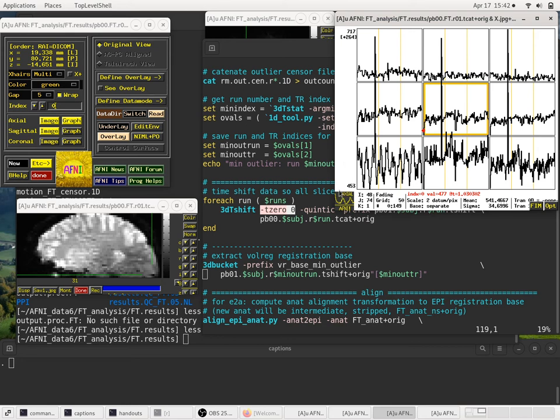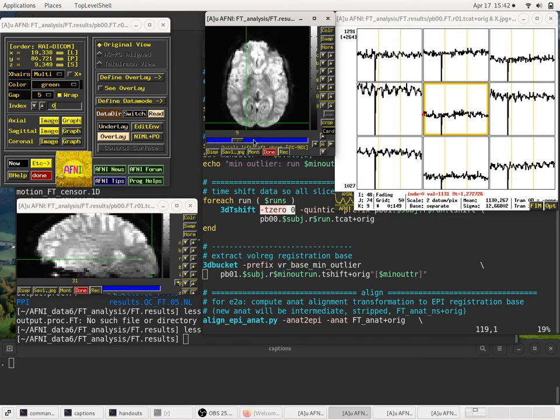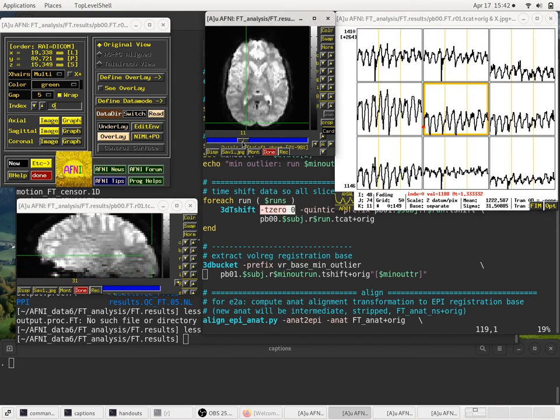Just to note what this looks like over time, let me jump back to slice 11, say. That's where we were at. And so we're at time 1.33. If I jump through time here, if I put my cursor over the graph window and hit the right arrow or the greater than key, you see we jump time equals 1.33, time equals 3.33, 5.33, 7.33. So at each time point jump, we're moving 2 seconds later on. So the TR, the time between volumes, is still 2 seconds. There's a 2 second difference, but we're always 1.33 seconds into the TR for all the voxels in slice 11.